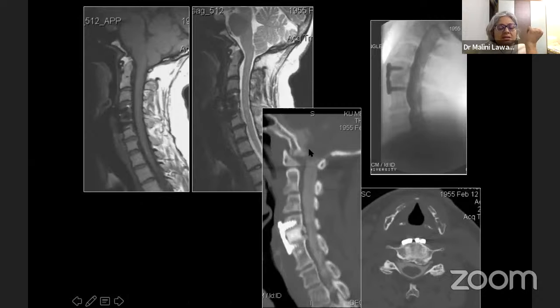But because there was clear radiculopathy at that level, a CT myelogram was done. And what you can see here clearly are these large left paracentral peridiscal osteophytes, these end plate spondylosis changes, which were abutting the nerve root and were the cause of the symptoms.